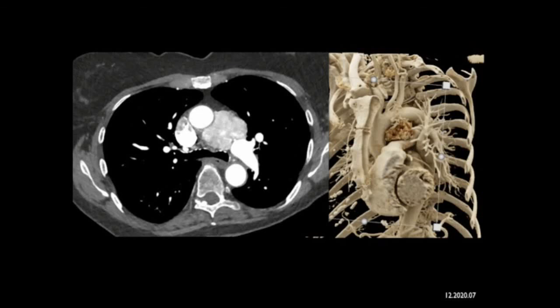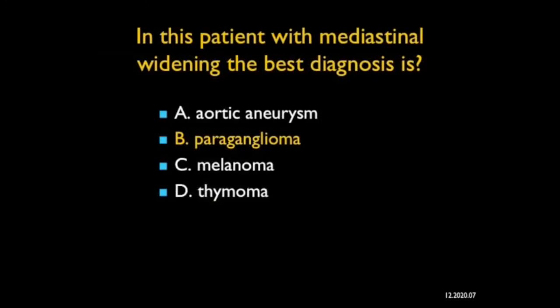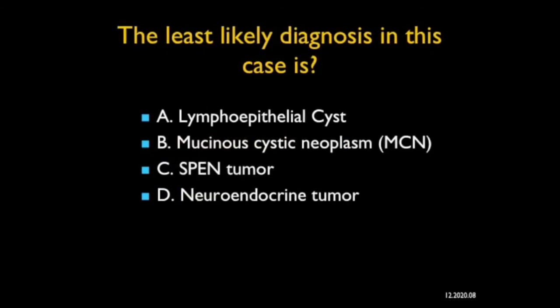Melanoma, the nodes usually aren't that vascular in the mediastinum. This is not a location for thymoma, but you can consider a thymus or thymoma in any mediastinal mass, or at least consider it. Maybe it grows there. But this is a great location for a paraganglioma. It's an uncommon mass, but vascular wherever they are, in the peripancreatic region, in the adrenal bed, at the organ of Zuckerkandl. Beautiful example of a paraganglioma in the AP window. Classic chest location.